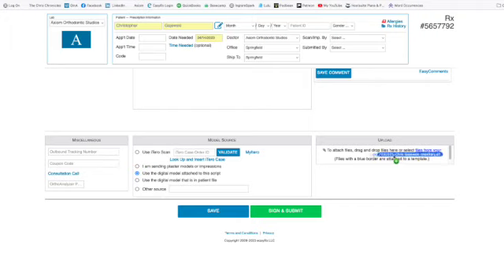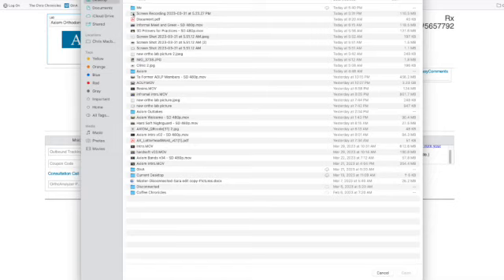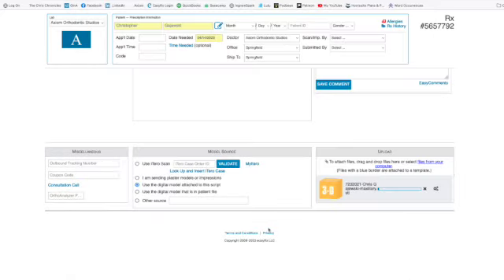This screen capture thing is okay. Or files from your computer. Desktop, me, maxillary, open. And that's it.